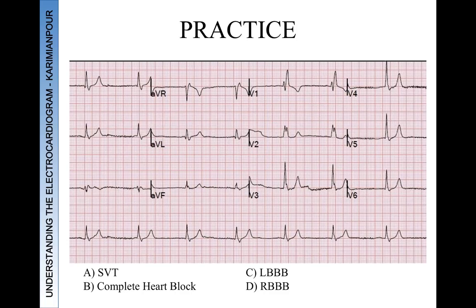What about this one here? Let's pause the video. Okay, and we're back, and so this one here, looking across the rhythm, it's a sinus rhythm. All that aside, since we're talking about blocks, we can see that V1 and V2 have the RSR prime, especially V1, there's an RSR prime pattern.